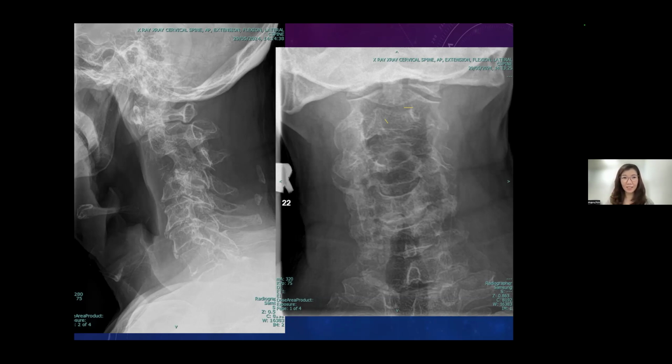Come on, guys, we are running out of time. Somebody said the C3 vertebral body, I also agree. C2, 3 is not 3. 2 is here, this is 3. One level below the 3, so it's 4. C4, yes. So C4 is missing. It's disrupted already.